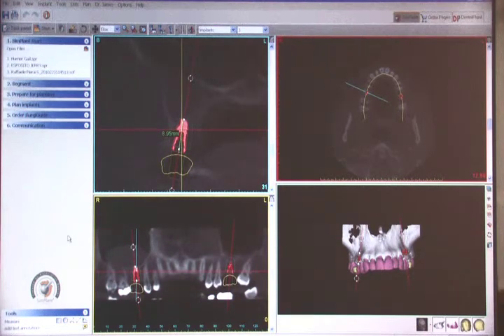You're an old friend and a very experienced implantologist, so I don't need to obviously tell you anything about how to place implants, but what I wanted to do is just go through with you the views we have with the Implant software. Yes. And we had tentatively dropped in the implants where you had requested them, and then what we can do is go ahead and change those per your recommendation, since you're ultimately going to be the one placing the implants.